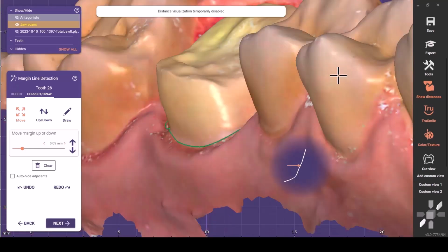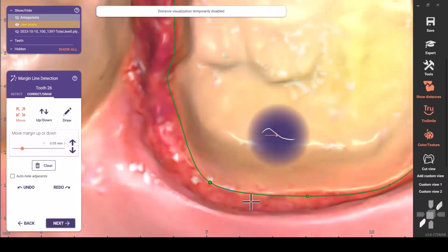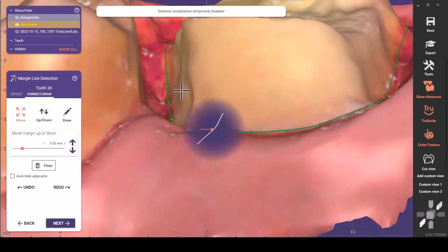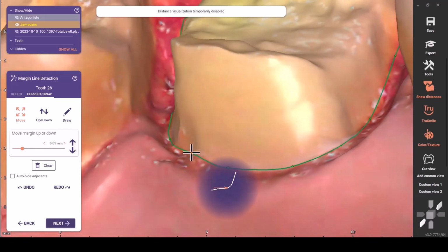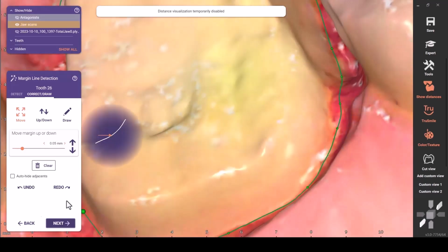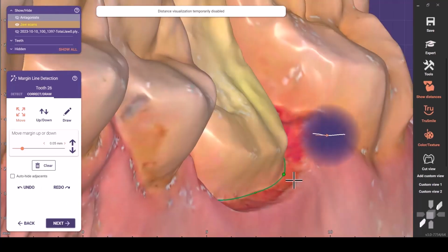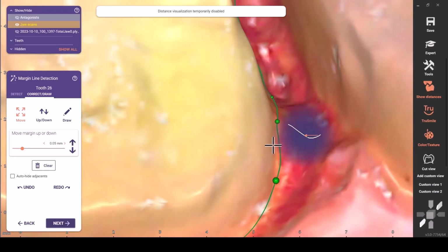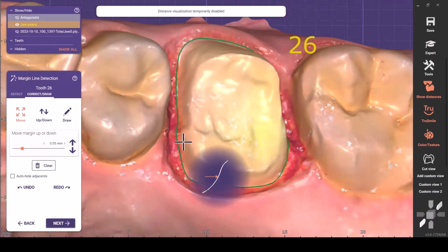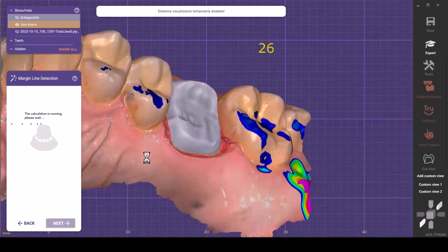removing some points, using control and the scroller on your mouse. There will be other videos about the hotkeys. Now I'm adjusting the points, making sure of the homogeneity of the points and that I'm around the tooth in the appropriate position. Checking the finish line from different views.